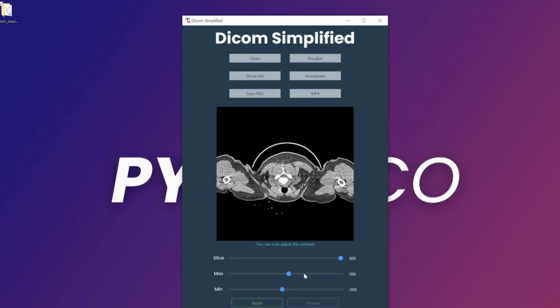Okay, let's leave it like this, for example. And you see here we have the image with the values. I can go up to 200, why not? We need to be more sensitive. I am just clicking here, and you see that it is being changed here. So everything in this application can be customized because I built it from zero.